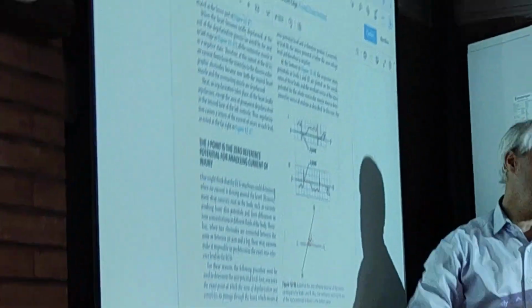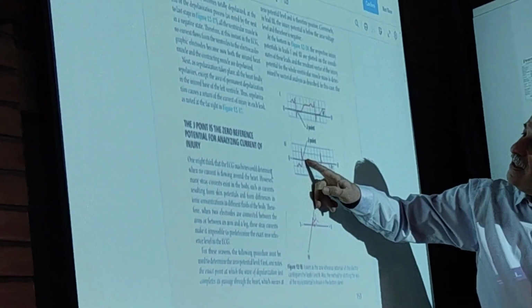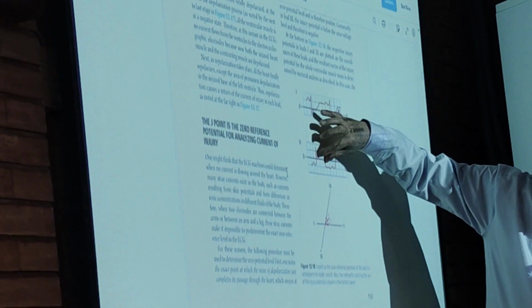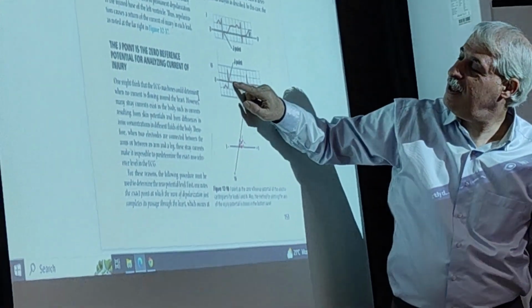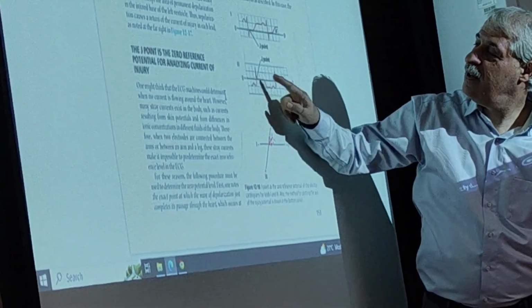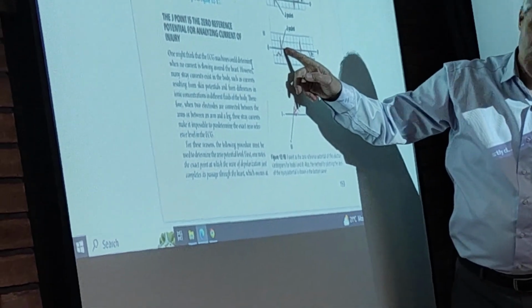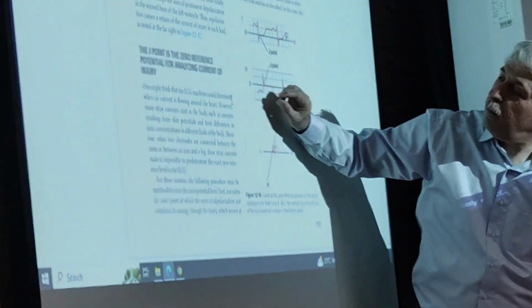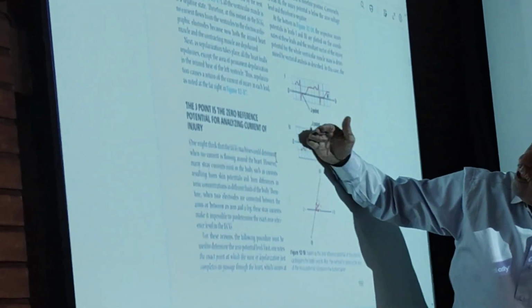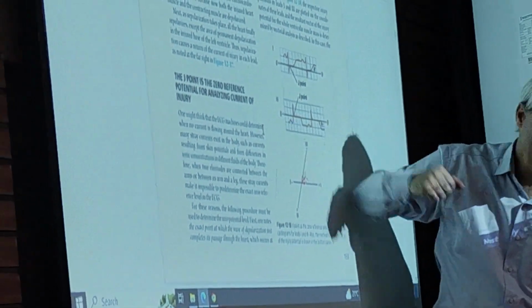This is limb lead 3. This is the TP. Make a perpendicular line here. From the T to the previous P, see, this is the previous P. Part of the ECG trace, which is here below the TP line, is negative.